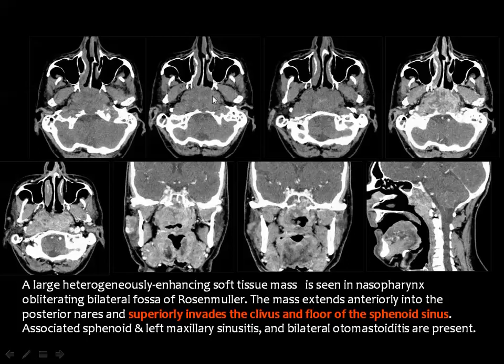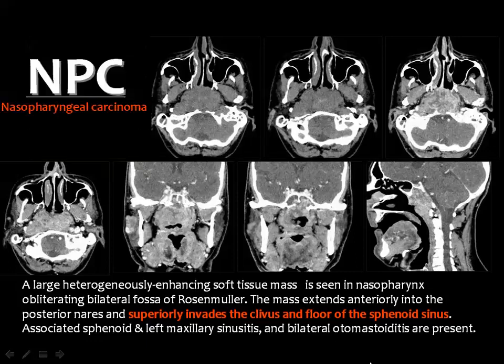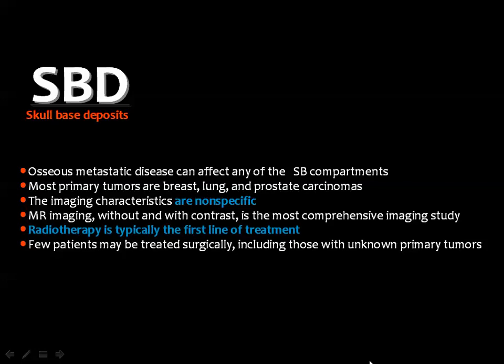It involves both sides of the nasopharynx, more on the right side, with destruction of the skull base and extension and invasion of the sphenoid sinus. Then we came to the skull-based metastasis.